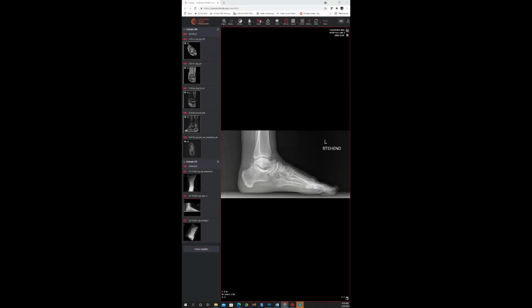Great. So thank you for sharing this case. This is a patient who is presenting with foot pain. And what we're seeing here on the lateral projection is that the posterior fibular positioning is present. When we look at the calcaneal pitch angle, it is not super elevated, but we have tibiotalar degenerative change, talonavicular degenerative change, and we have an apex of this cavus deformity at the level of the Lisfranc joint.